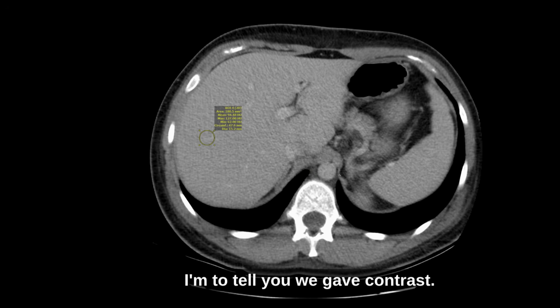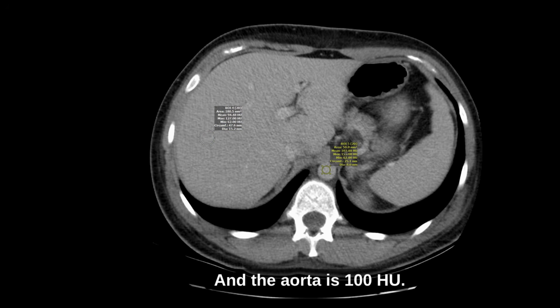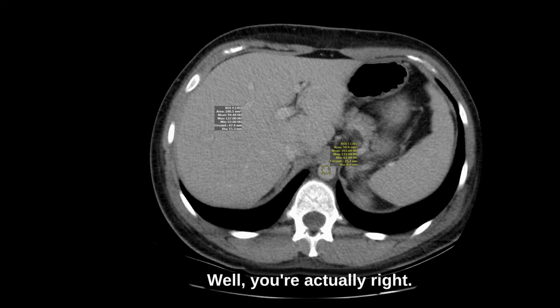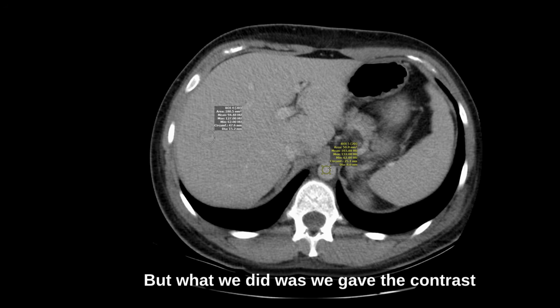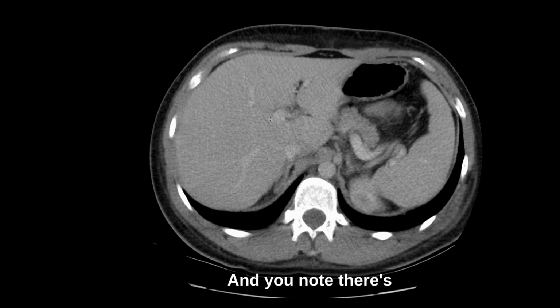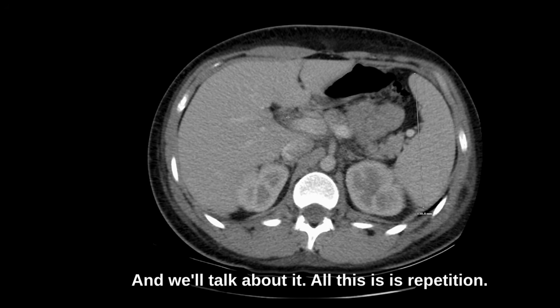I'm going to tell you we gave contrast. How do I know that? Well, here's my aorta, and the aorta is 100 Hounsfield units. If it were straight blood, it would just be 40 Hounsfield units. Now, you might be saying, hey, it's not that bright. Well, you're actually right. If it were arterial phase, it would probably be 300, 400 Hounsfield units. But what we did was we gave the contrast and we waited 60 seconds. This is the portal venous phase. And you note there's the portal vein going to the liver. That's nice and opacified.